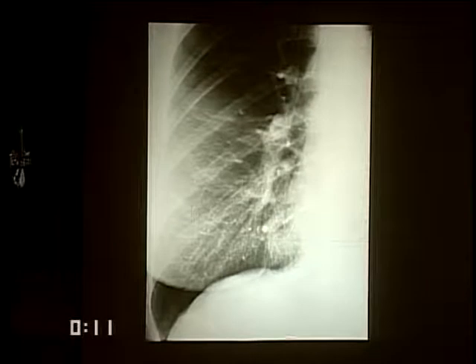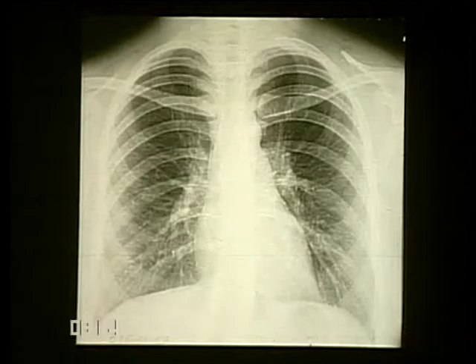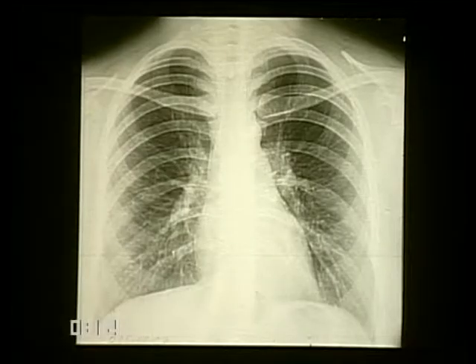These are 2 examples of normal individuals, and they are obviously rather gross, giving you an idea of things that can conceal or things that can mimic interstitial disease. Soft tissue: in very obese individuals, it is exceedingly common to either undercall or overcall interstitial disease. If the periphery of the lung is inadequately exposed, interstitial disease may be simulated or concealed.